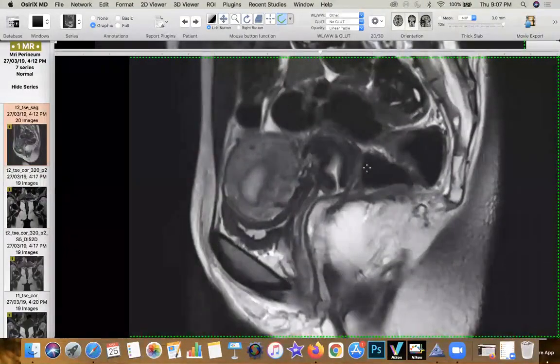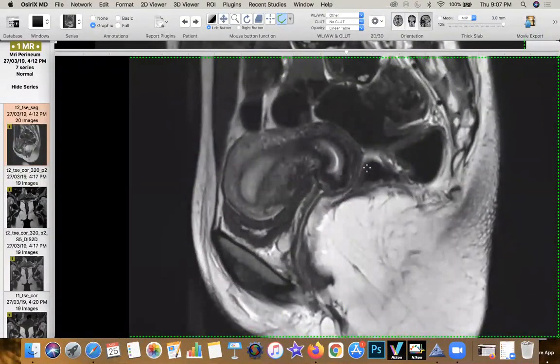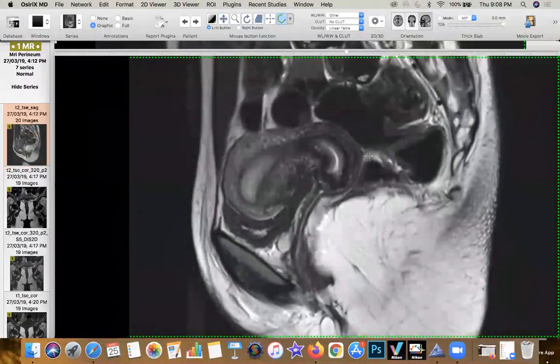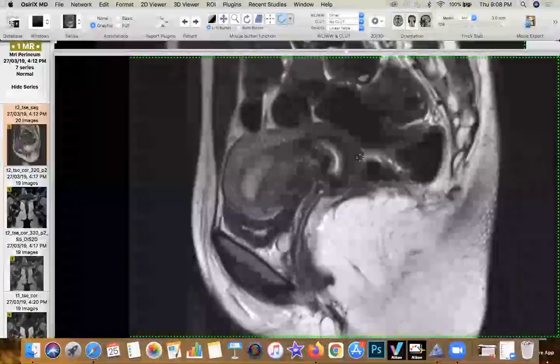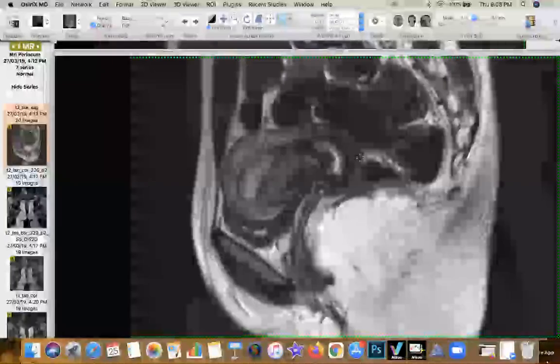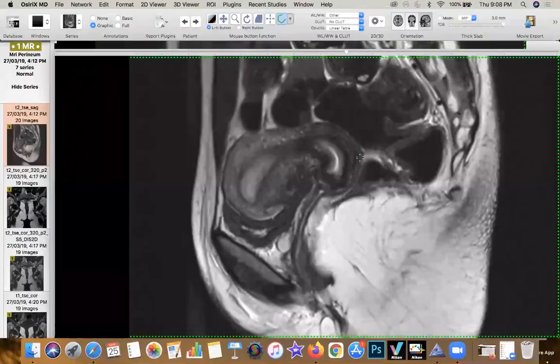And by and large, the peritoneal reflection is seen at the level just above the torus uterinus. Now, the torus uterinus is a kind of a structure which is located along the posterior wall of the uterocervical junction and the upper third of the cervix, which gives attachment to the uterine end of the uterosacral ligaments. Now, what happens is the peritoneal reflection is located above the uterosacral ligaments. The uterosacral ligaments are condensations, which basically are posteriorly attached to the sacrum, and they give the tug onto that sacrum itself.